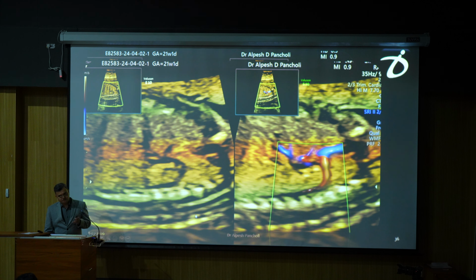So coming to ductus venosus, it is a funnel shaped or trumpet shaped structure. With the help of the eustachian valve, because of high velocity, there are 2 streams of blood flow. One from the IVC that has slow flow. Because of high velocity, the ductus venosus flow hits directly to the foramen ovale flap and goes directly into the left atrium. And the flow from the IVC, because of this eustachian valve, goes directly into the right atrium.